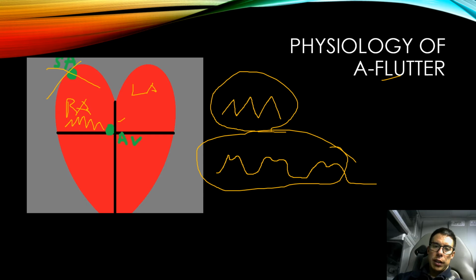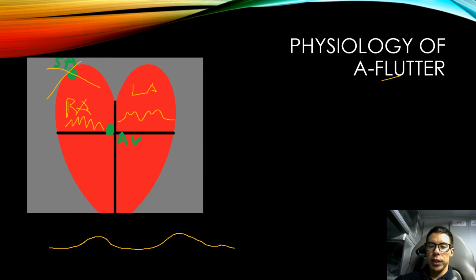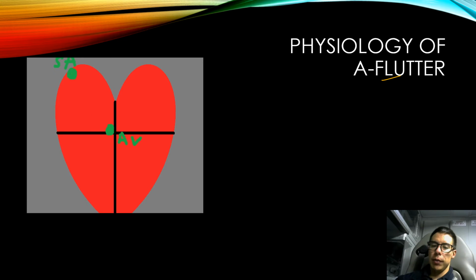But there are all kinds of different variations, and if it's not that regular sinus P wave, where it's upright, round, and symmetrical, then you know it's an atrial P wave. We'll talk about P wave morphology and what it means as far as location in the advanced course once I make that.